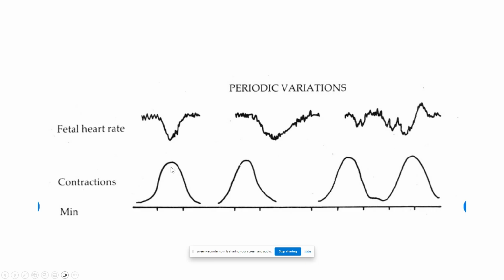Now, I want you to remember this. It's always good to come early to class, and it's not good to come late to class. What I'm trying to say is an early deceleration is not something that I would freak out over if I am the nurse and I'm monitoring this patient. The late deceleration is the bad one. So, early deceleration is when the fetal heart rate is mirroring the contraction.